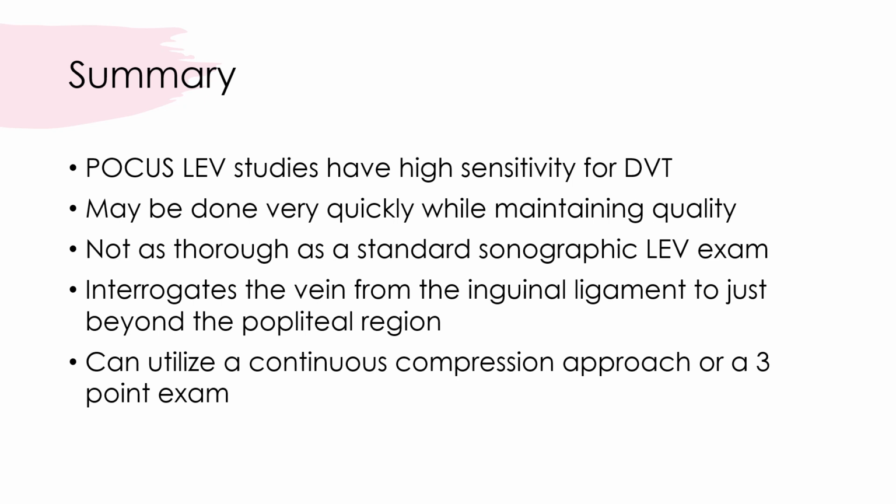So our summary: point-of-care ultrasound LEVs have a high sensitivity for DVT. They can be done very quickly, especially if you do the 3-point evaluation, while still maintaining pretty good quality. They're obviously not as thorough as a standard sonographic LEV exam, but sometimes they can help a practitioner decide if that's somewhere they want to go with that patient or not. It interrogates the vein from the inguinal ligament to just beyond the popliteal region, and it can utilize a continuous compression approach or a 3-point exam to accomplish the required outcomes. Again, you're only limited by the skill of the practitioner and the extent of the exam.